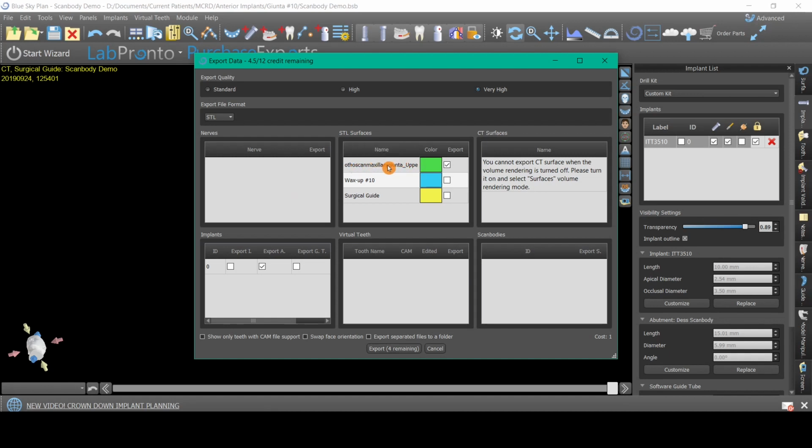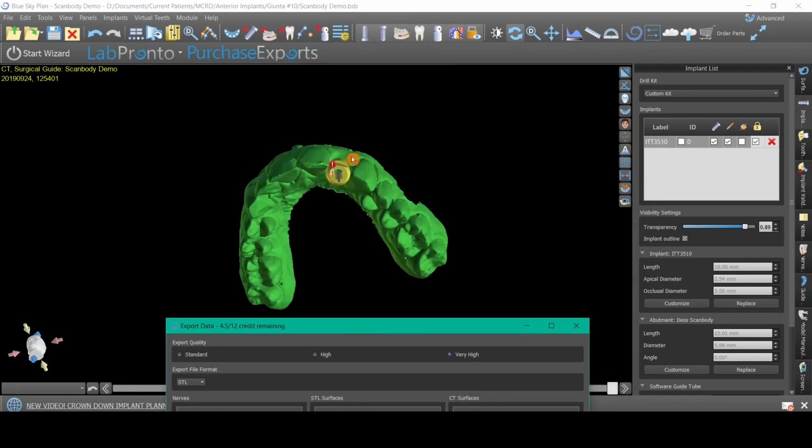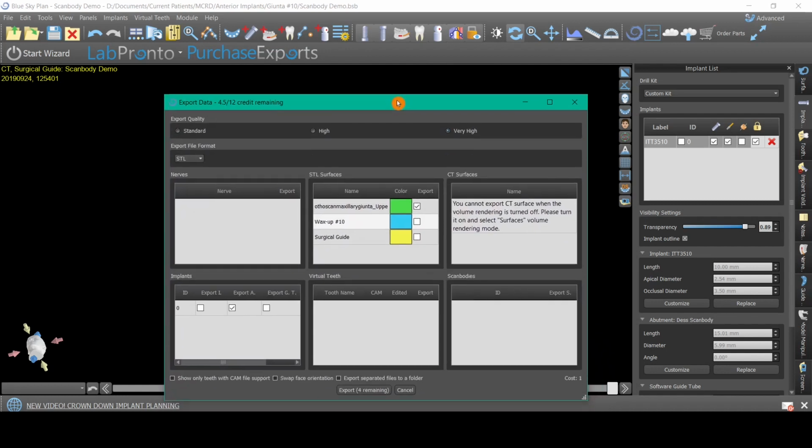So if you had a patient that had the tooth present, you would want to digitally remove that tooth, or have your lab do that, because you basically want an edentulous situation right here, so you can have a scan body where the tooth used to be.